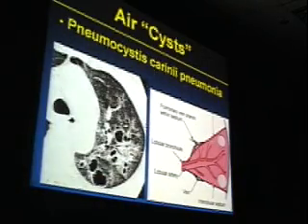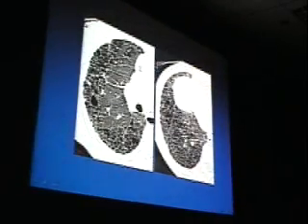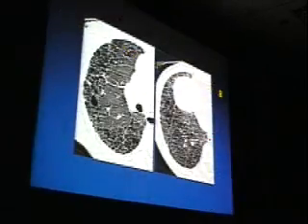They may not have been diagnosed as having HIV disease. They simply present with progressive dyspnea. We scan them, and we may see thin-walled air-filled cysts and scattered areas of ground glass opacity. As you may know, it is no longer pneumocystis carinii. It has now been renamed pneumocystis jirovecii. So most people just refer to it as pneumocystis pneumonia to eliminate the pronunciation difficulties.